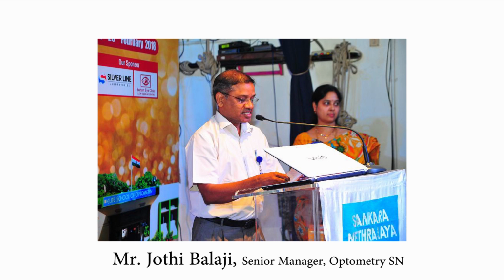Third is an axial difference, that is peripheral refraction related. There is an asymmetry between the nasal and the temporal. Nasal is very different compared to the temporal. Because of that, we do get mirror artifact. So these three things are majorly causing problems, and they invariably affect the quantitative measures, especially the microvascular related ones.